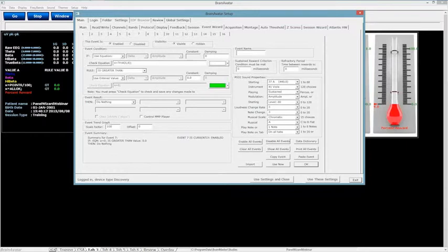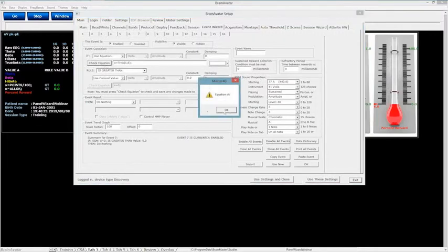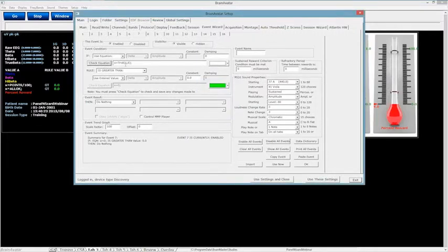A 1,6. Okay, so for those of you who have been in my event wizard training or know what I'm putting in there, I am now looking at the amplitude of my first channel and my 6th band, which for anybody who knows that, I'm looking at high beta for that band.